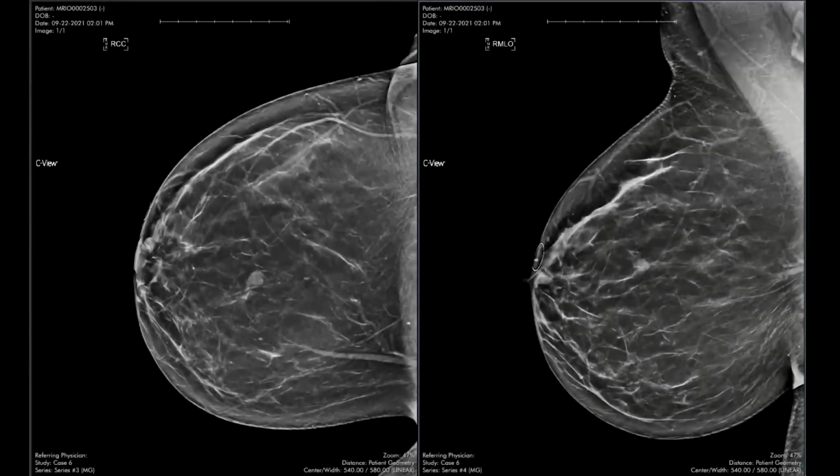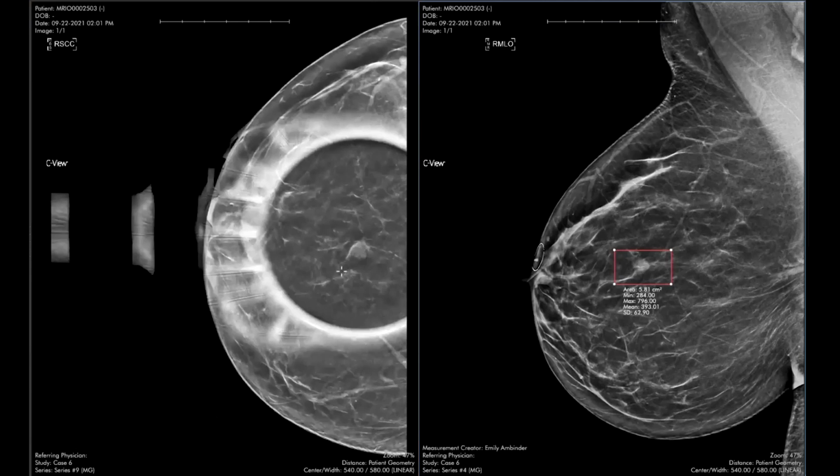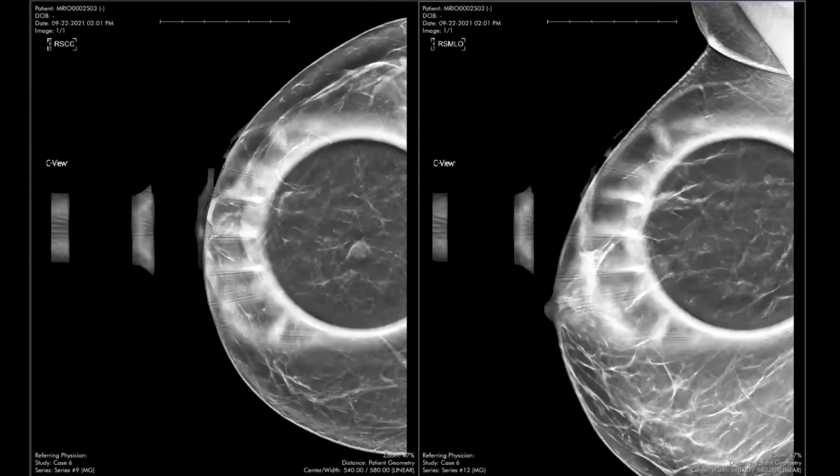Okay, and this is if you have another baseline screening mammogram and another oval circumscribed mass, and this is in the central right breast. You can see here. And again, we have the patient come back for those spot compression images, and we see that finding persists here.